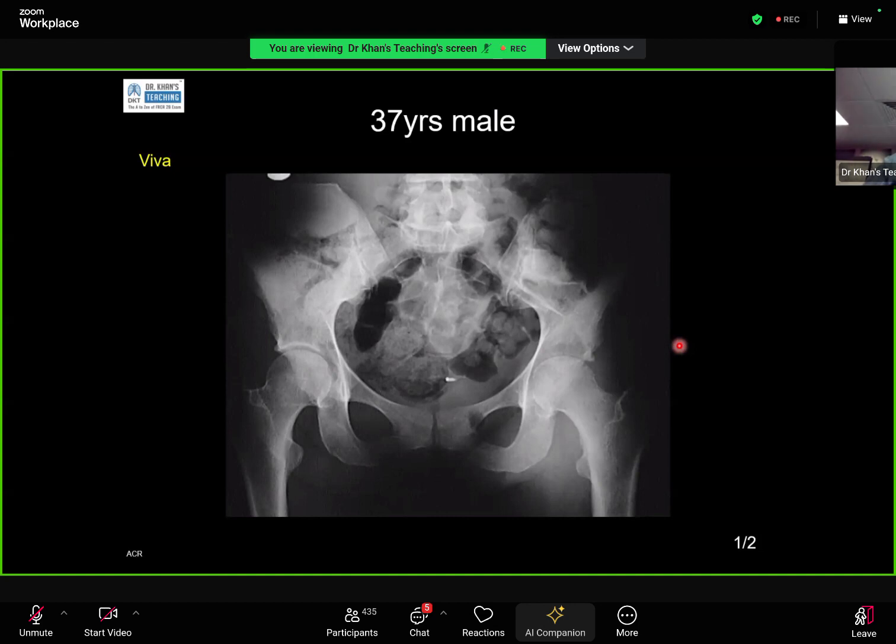So to do MRI? Yeah. So in children, the point is that ultrasound confirms it, and you treat it aggressively. This is quite a full-blown case. Here, distension of the fat planes will be difficult to see in adults. But what is happening is that there is soft tissue, obliteration of the fat plane, and increased density, which is, here there is fat, and here there is a bit of soft tissue.